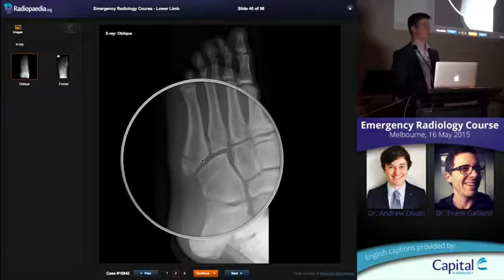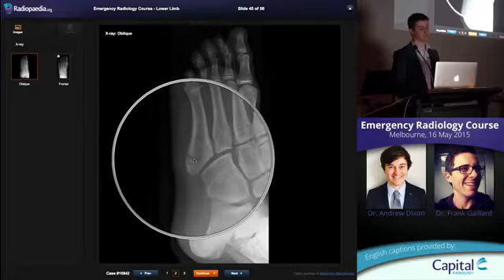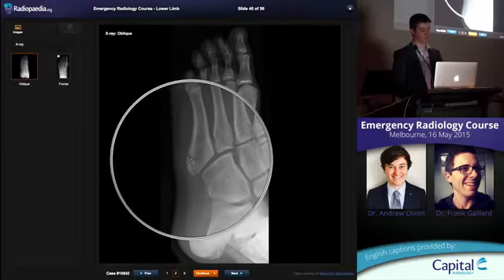Fractures are always transverse. So in this patient, this is the normal apophysis, this is the fracture. So it's worth noting, because we have people where there's no fracture come to us all the time and say, oh, there's a fracture here. If it's longitudinal and they're a kid, then it's going to be the apophysis. Look for a transverse line.